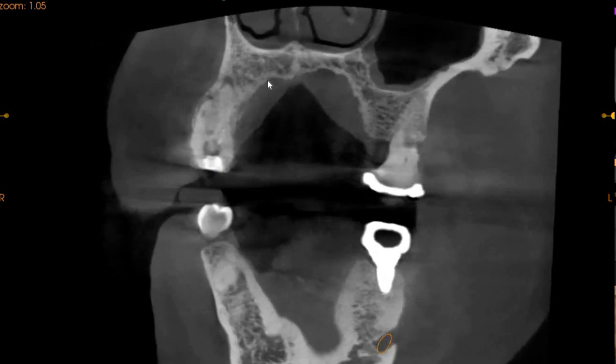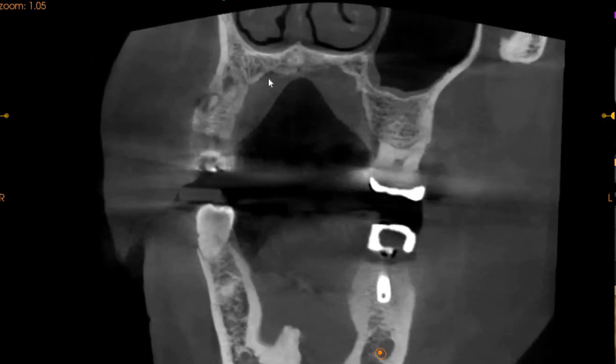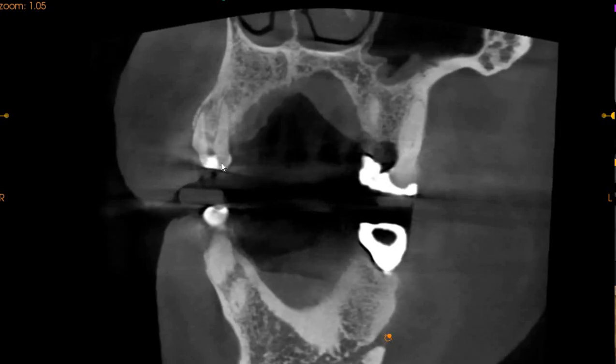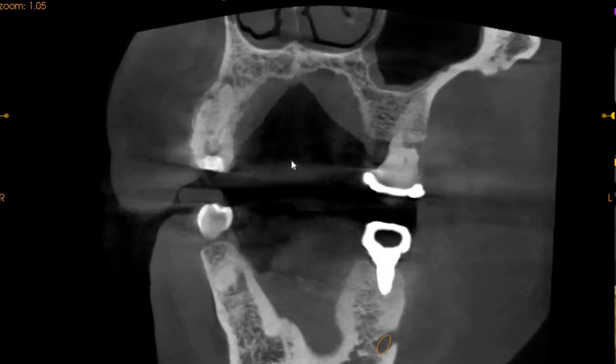Both of them show signs of periapical radiolucency, and this is where we can see that there is a slight communication in the interradicular bone as well. So there's not a clear cut picture, but we do have signs, and we can see on some slices that there is presence of a crack leading to a periapical and an interradicular infection in this tooth.